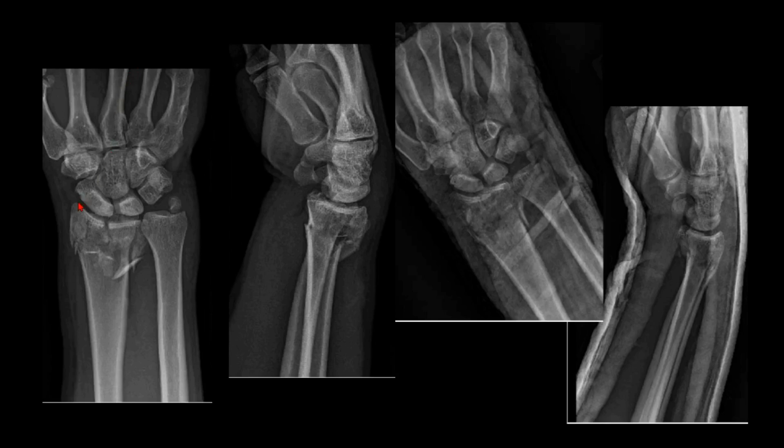And what you see here is a PA film of the wrist. You see the distal radius right here, and the ulna, okay, and the carpal bones. And the obvious fracture of the distal radius here, okay? So you see a nice fracture fragment through the articular surface. You see comminution. There's multiple fragments here. Very ugly looking fracture pattern. There's also an ulnar styloid fracture here.